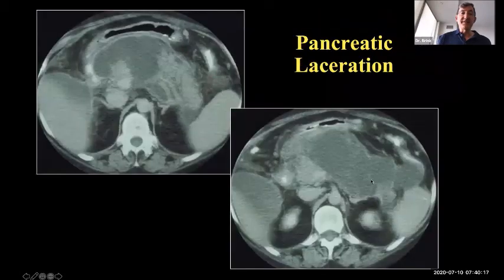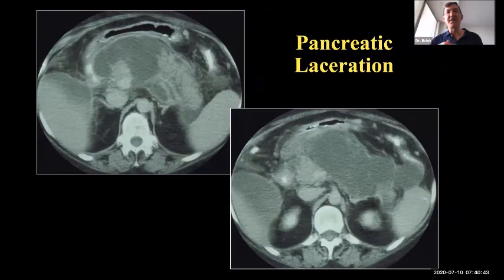And it shouldn't surprise us that on CT we see that there's been a complete transection of the pancreas with a large fluid collection that has dissected open the transverse mesocolon ventral to the pancreas and is extending to the splenorenal and gastrosplenic ligaments laterally. Again, we might in other times call this just a pre-pancreatic fluid collection, but again, I encourage you to think about where that is opening up that same potential space we looked at earlier within the transverse mesocolon. These fluid collections are typically subperitoneal, and that enables them to connect to other subperitoneal locations such as splenorenal and gastrosplenic ligaments.